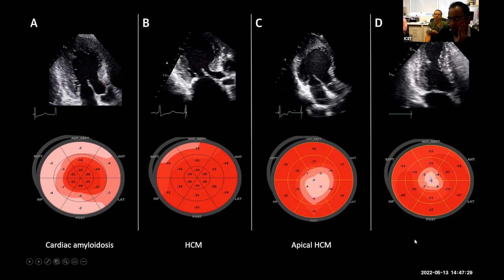And what about the last segment? Is that blue? Look at the myocardium. Yeah, quite thin. So it's a thin infarct, and aneurysmal. One of the things that was raised, having a look at the image, is that the apex looks quite thinned out. Obviously, it's associated with reduced strain in that segment. So one of the things you would consider is whether it's an apical infarct.